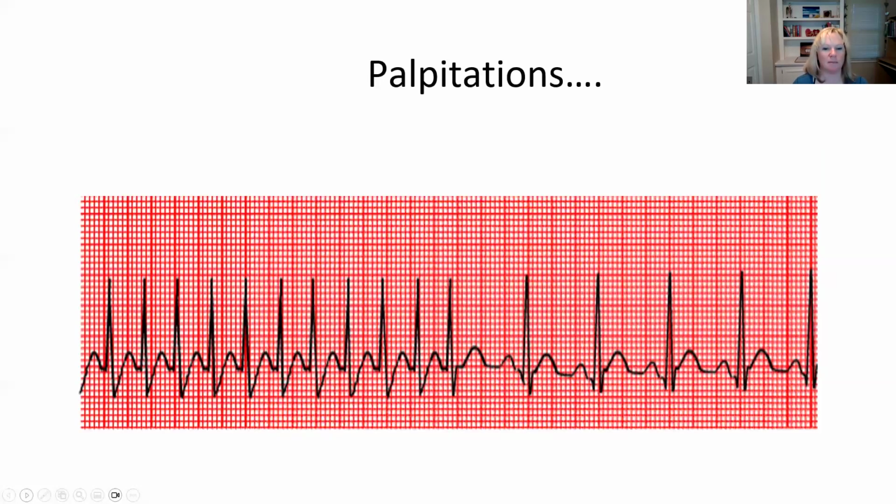Okay, let's do a couple of these strips. Let's just do some practice time. What's this called here? You can see fast and regular, and then back to normal. Oh, now we're normal. Okay, it could be sinus tach, but it's pretty fast. Yeah, it's too fast, right? And this is indeed an SVT converting into a sinus. So yes, Marcia, this is a PSVT, standing for paroxysmal SVT, and it went away. So good. SVT is transitioning to sinus.